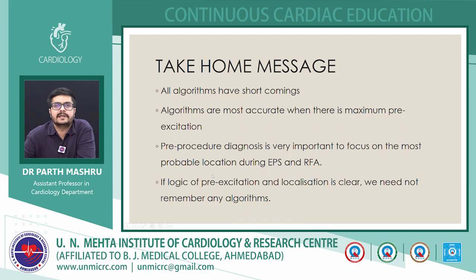And if the logic of pre-excitation and localization is clear, we need not remember any algorithms at all. So even I don't remember any steps of any algorithms, but if we see an ECG in an OPD and apply proper logic of localization, we will never go wrong on the localization of the pathways, and you can also plan the ablation better and explain the risk to the patient and relatives better if you are accurately diagnosing the pathways.